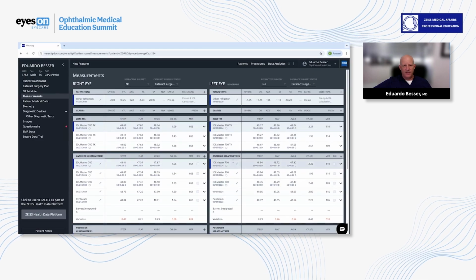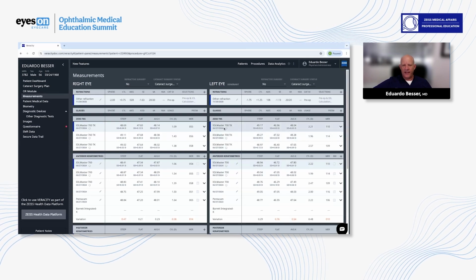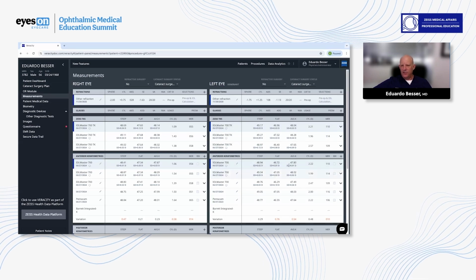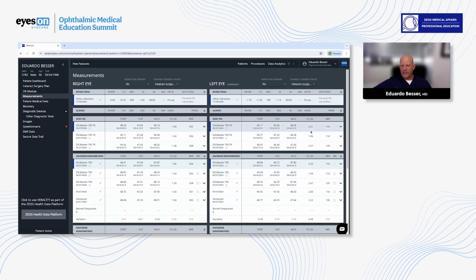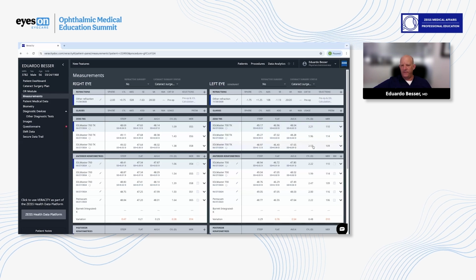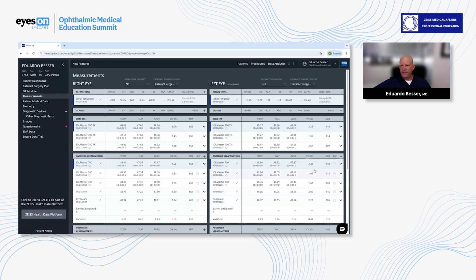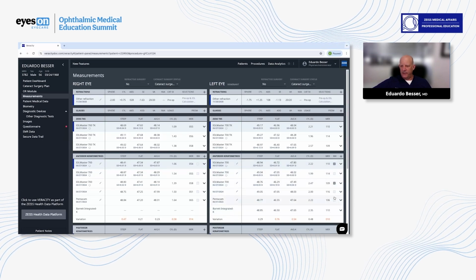The other thing about here is, this little blue line here, that's what will actually be used in your cataract surgery plan. So it'll use these Ks, these Ks, these Ks. You can select whichever one you want to use. So for the total K, there's 221, 196, or 257. Now, as I said, I think this variability is because of my dry eyes. But the Pentacam doesn't depend on the tear film. And so we can select this one, say this one, and this one.